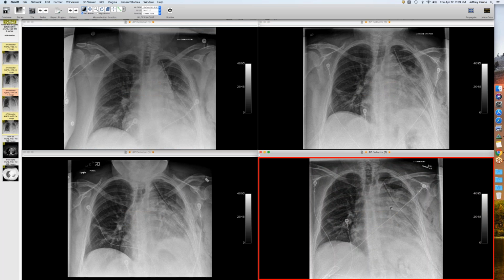And so in discussing this, we were concerned that if it were edematous and she wasn't febrile or anything, that this wasn't infected, that there could be some perfusion problems with the remaining lobe. When you look at the orientation of this, it doesn't look like there's a torsion based on the airways you can see and the fact that we see the apical pleura there. And the patient was doing fine, but we did raise the question, could there be a perfusion problem in the absence of infection? It was a difficult surgery because she had pre-existing adhesions. It was done with a VATS.